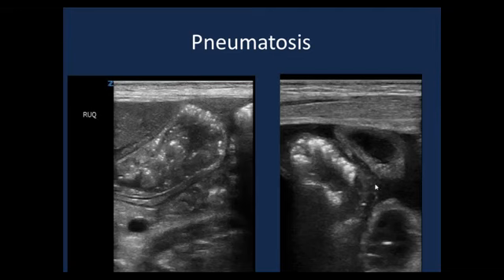And in this image we can see multiple loops of the intestine, and the signature is lost. So that's a sign of significant ischemia. So we have a loop, another loop, and a third loop, and in between these loops are floating in peritoneal fluid, which is black and hypoechoic in ultrasound. And this loop is extensively affected by pneumatosis compared to other loops.